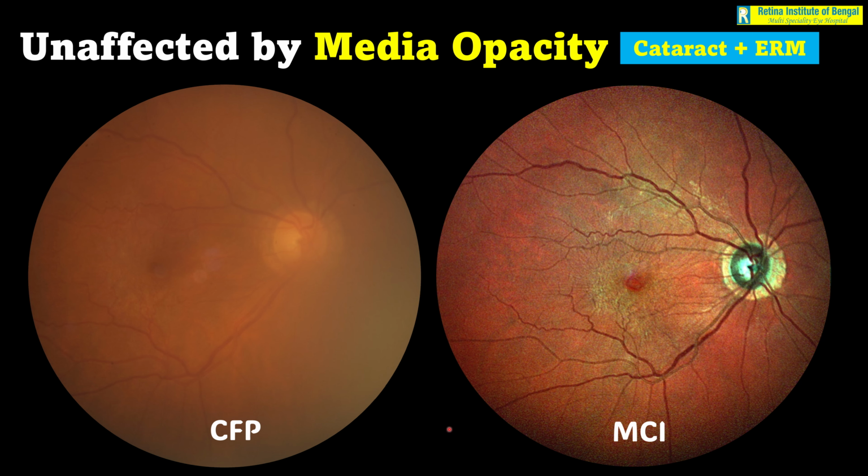If you have patients of cataract who have been sent to you for retina evaluation prior to planned cataract surgery, often it's very difficult to make out, even with fundoscopy, especially in presence of a hazy dense cataract, fine abnormalities on the retinal surface. Like for example, if we see this color fundus photo, we can see half of it is not clear because of the media opacity. Whatever little is seen, it appears normal. You really can't comment much.